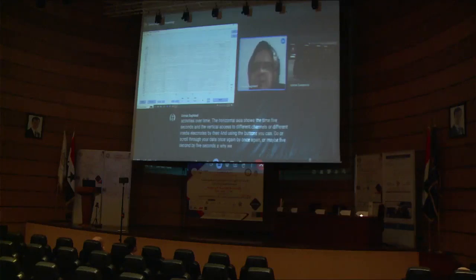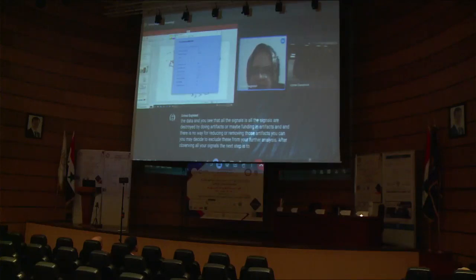Why do we do it? Because we become familiar with special kinds of noise and artifacts. We can scroll the data to see if there are some special kinds of artifacts or noise in our data, and whether our data is usable or we should exclude it. For example, when you scroll the data and you see that all the signals are destroyed by chewing artifacts, or phone ringing artifacts, and there is no way of reducing or removing those artifacts, you may decide to exclude this signal from your further analysis. After observing all your signals, the next step is to set channel locations if it is no.